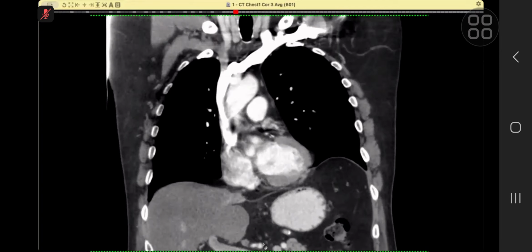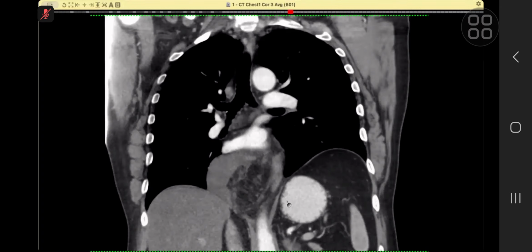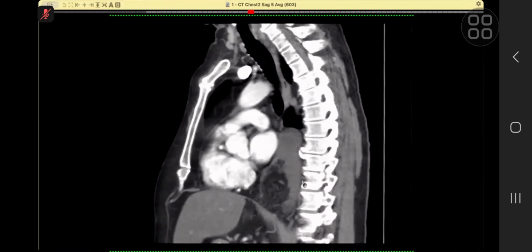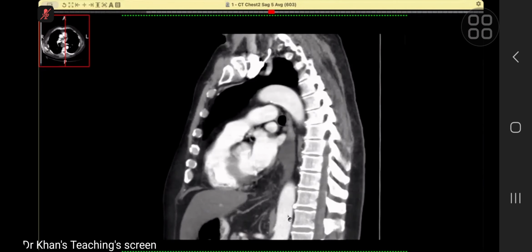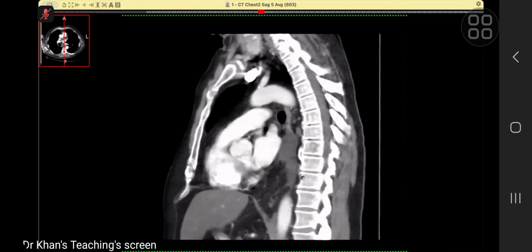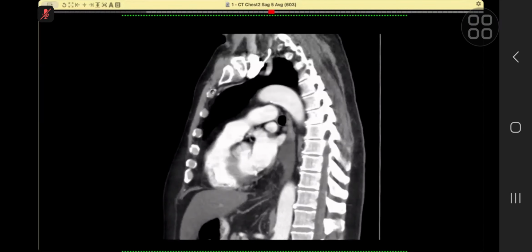Look at, for example, this vessel, and trace this vessel, and everything is going into the hernial sac. If I show you a sagittal, you will again see it, and this you will be able to relate with the lateral X-ray. So this is the diaphragm, and here you are. You can see vessels going in, and you can see that there is a bit of trapped fluid. So I think this lateral really helps you consolidate the findings on the lateral X-ray. Okay, good, well done.